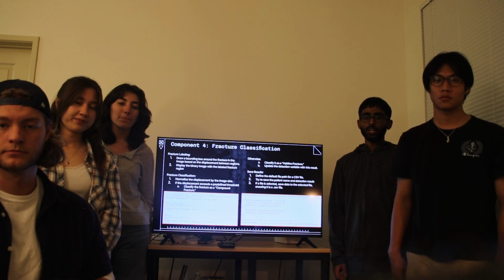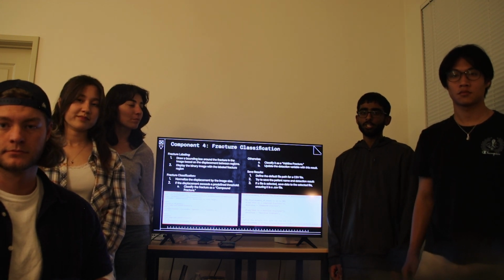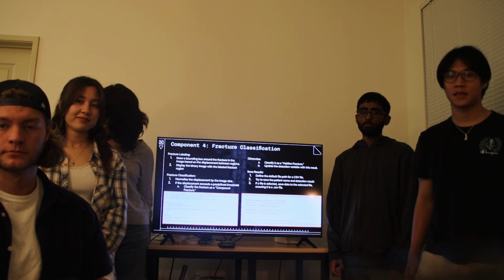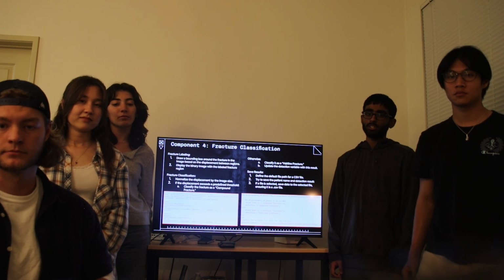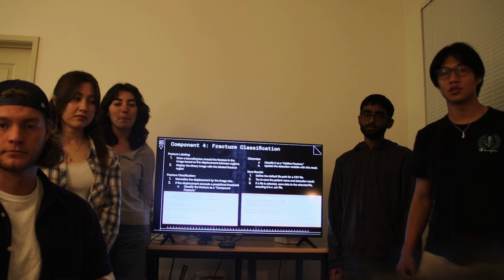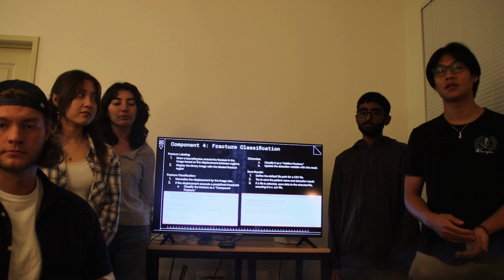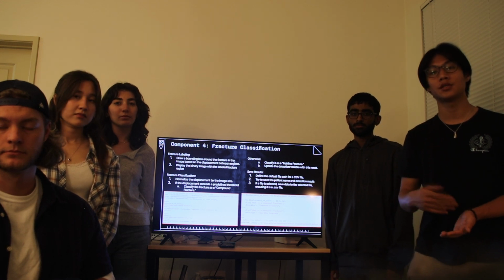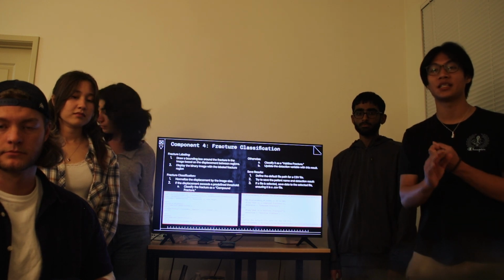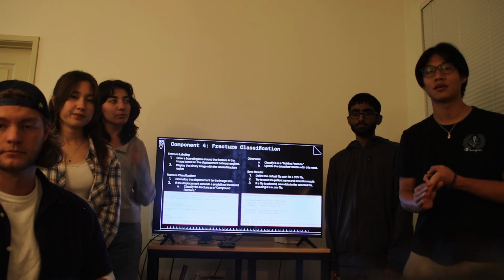And then to classify the fracture, we looked at the displacement between the bounding boxes, and if the displacement passed a certain threshold, it would be a compound fracture, which is larger compared to a hairline fracture, which would be the case if the threshold is lower. Finally, we did a save results tab, where we would save all the data that we gathered into a CSV file, which would be easier because we focused our code on clinical use. So a doctor can access the CSV file, open it on Excel, and access the patient's name, the type of bone breakage that they encountered, and which date that it was recorded in.